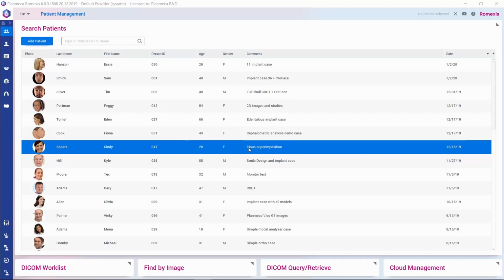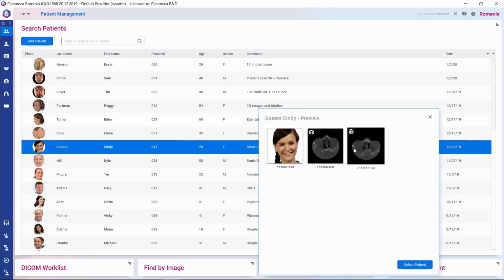For this, we need to have two 3D volumes. They don't need to be of the same size. They don't need to have the same resolution, as long as they have some common anatomy based on which the superimposition can be done. Let's start by opening the before volume.